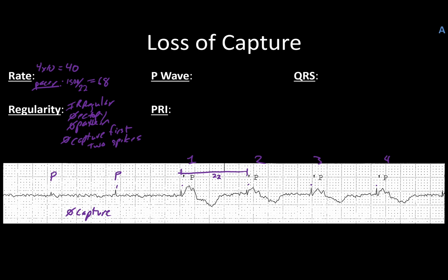Not to mention, a pacemaker should fire pretty regularly, so to have that distance go without a pacemaker being there to the rescue is another great sign. P waves, native. I'm going to say we either have, I'm hesitant to call it F waves because it's just so jumbly throughout, so you could question if that's the case.